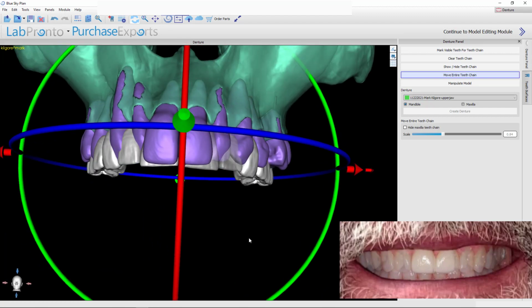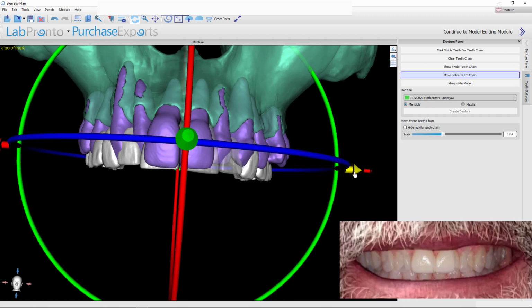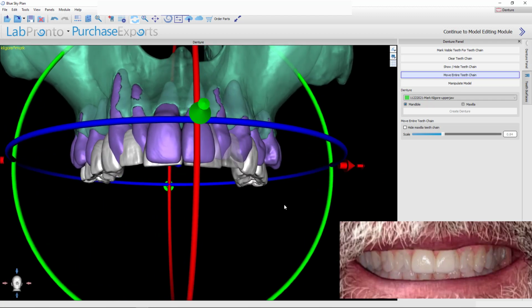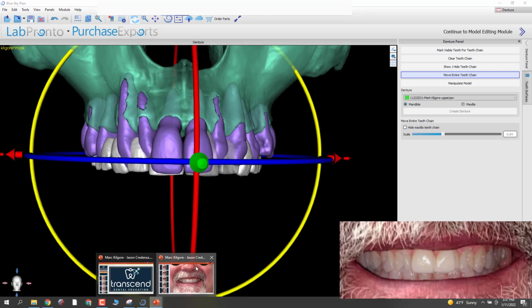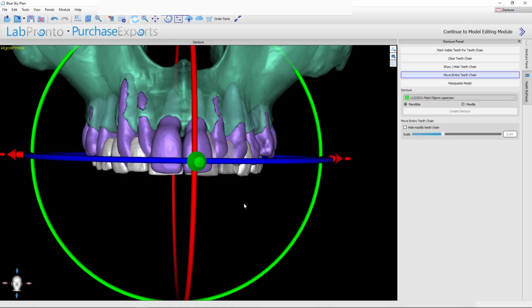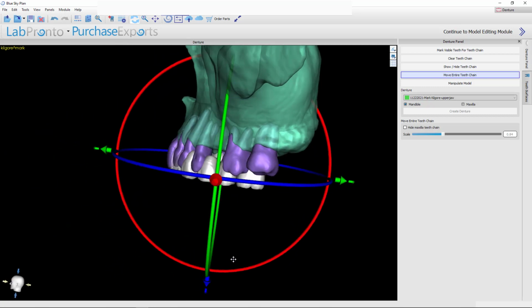All right, midline's kind of lined up the same there. Pull it over slightly, there we go. Contact points falling right there. Now let's reference length. How much longer was my simulation? And it really is not much longer, so about where I've got it. And now I'm looking at more or less just the occlusal plane.